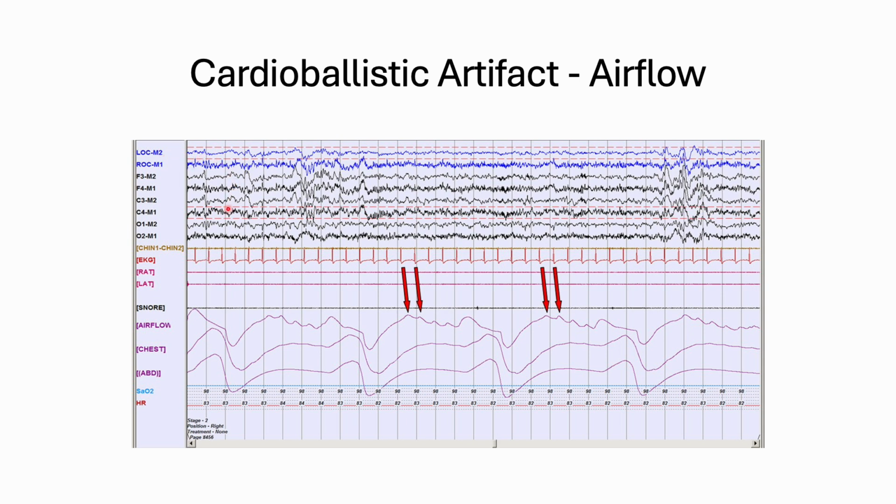What is the common electrode between the dark signals? M1, M1, M1, M1. Looks like at M1 there's either tension on the wire, or they need to scrub it a little better. Or you can re-reference all this stuff to M2, and you might have a clean looking signal like that. That's one way to get rid of that.